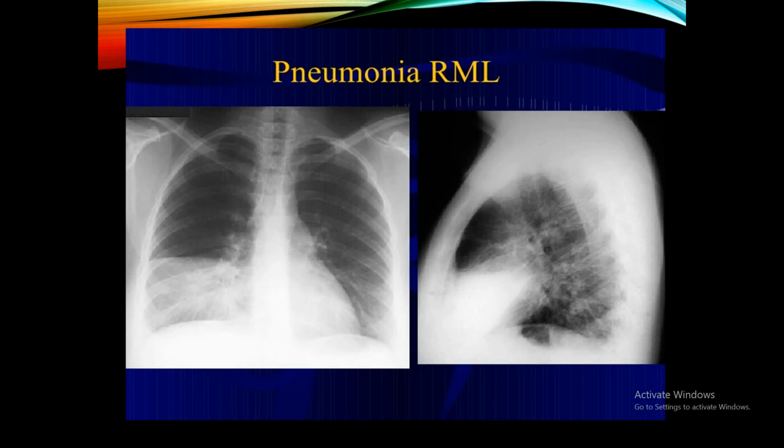فمعناها أنه this lesion is located in the right middle lobe، في حين أنه lower lobe is not affected because you can see the right dome of the diaphragm is very clear, means that the right dome of the diaphragm or the right lower lobe is not affected. بالlateral chest X-ray تلاحظون هناك triangular opacity تقع بين خطين، خط هو يمثلنا الhorizontal fissure والآخر يمثلنا الoblique fissure.